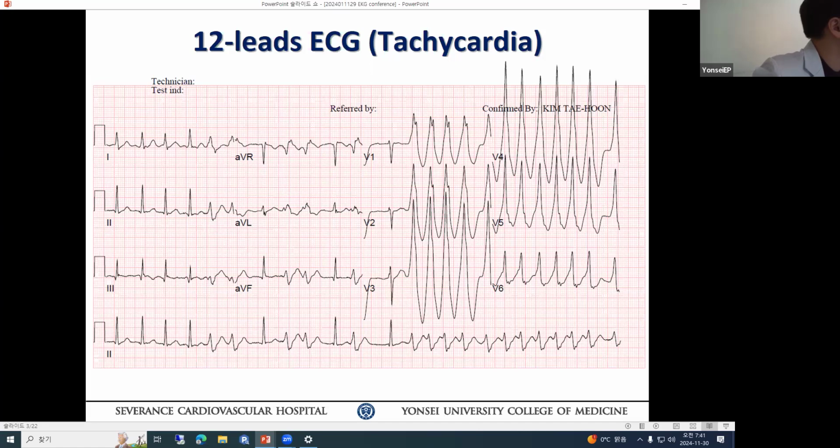Why I'm telling you that? QRS durations are pretty much similar, except a slight RR interval variation. That cannot happen if you have a focal exit. Second, automatic tachycardia tends to have acceleration, exit block and terminate, not continue. So there's few things that is not standard. Okay. So if it is a pre-excitation, where's the pathway?